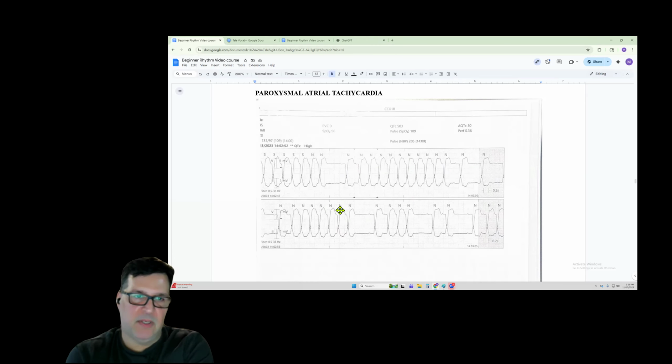This particular example looks a little different because it has a bundle branch block associated with it. There are very few sinus beats on this. You get a sinus beat here, some sinus beats there, a sinus beat, then some PACs. This little salvo is a non-sustained SVT. One, two, three PACs, PAC. This would be a short run of SVT.